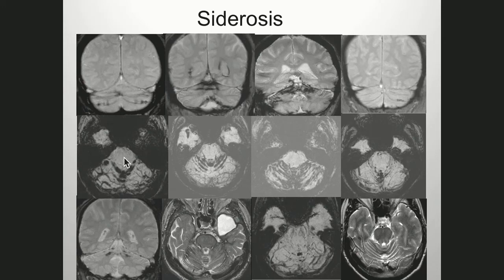fossa. These are 12 different patients you see here, and each and every one of them was diagnosed with CSF leak eventually, either before or after. Not all these cases are incidental, but like I said, in a few cases we've been able to point the clinician to the right area of investigation.